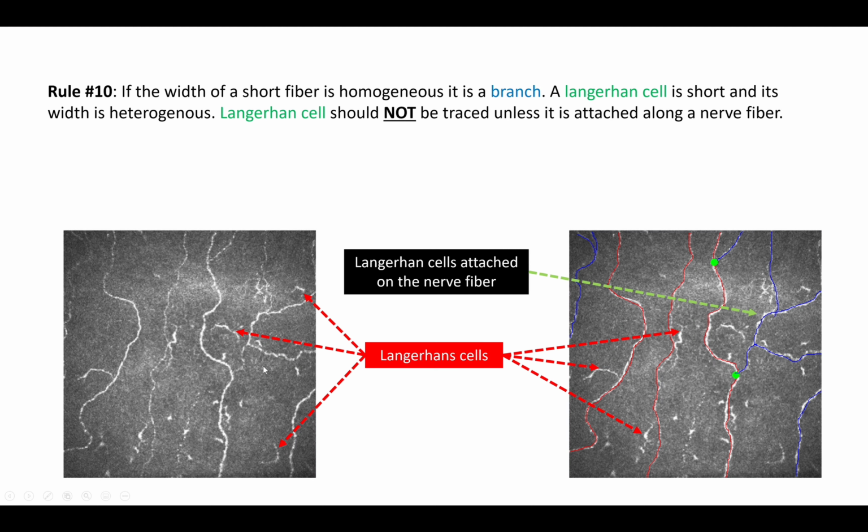However, this Langerhans cell is attached to a fiber. And you can tell it from because it extends beyond the Langerhans cell, and that looks like a fiber that rests. So that is why we would trace this, even though the Langerhans cell is attached to it.